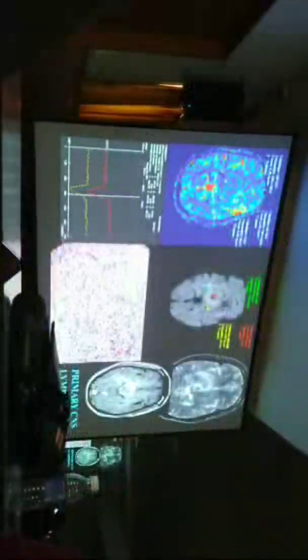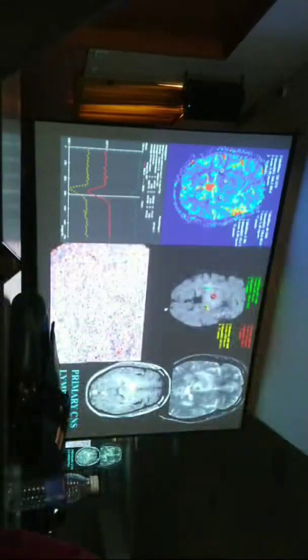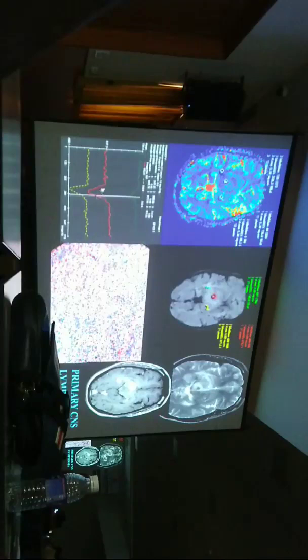Another tumor, in the periventricular or thalamic location, shows nodular enhancement. On perfusion, there is no significant increase or only a mild increase in the cerebral blood flow volume. What do you think this is? It's a tumor which shows normal perfusion or mild increase, and you can see that even on the post contrast it overshoots the baseline. This is the typical lymphoma. So again, perfusion is very useful to characterize whether it's high grade, low grade, or lymphoma.